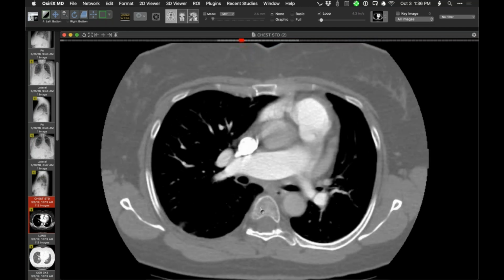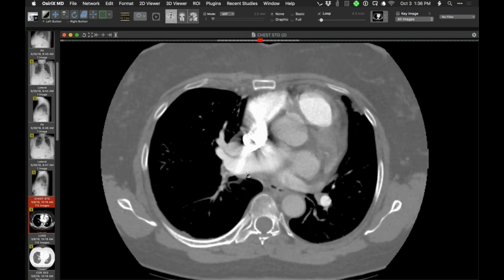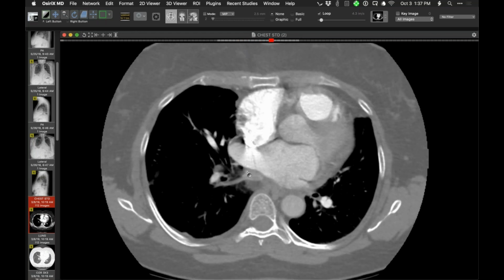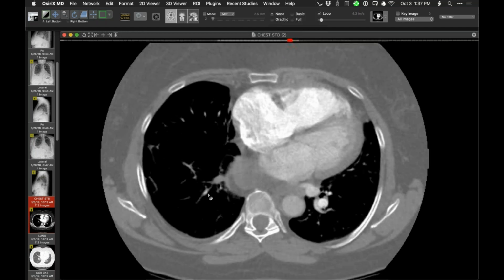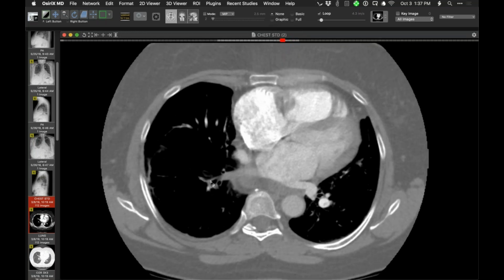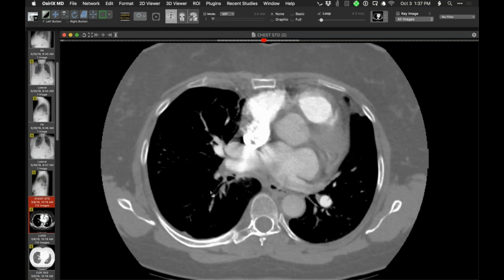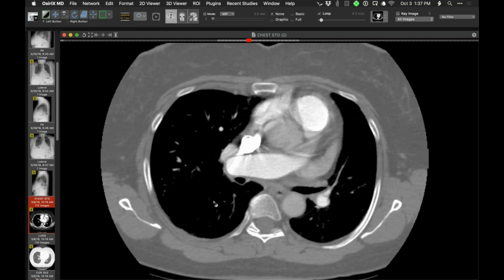And then perhaps the most dramatic change is looking at the right interlobar pulmonary artery, and as we go down, we just basically lose the pulmonary artery, and then we have no contrast opacified vessels there. So that's very abnormal. And I'm trying to remember if there were other findings of CTEPH, but that's pretty dramatic.